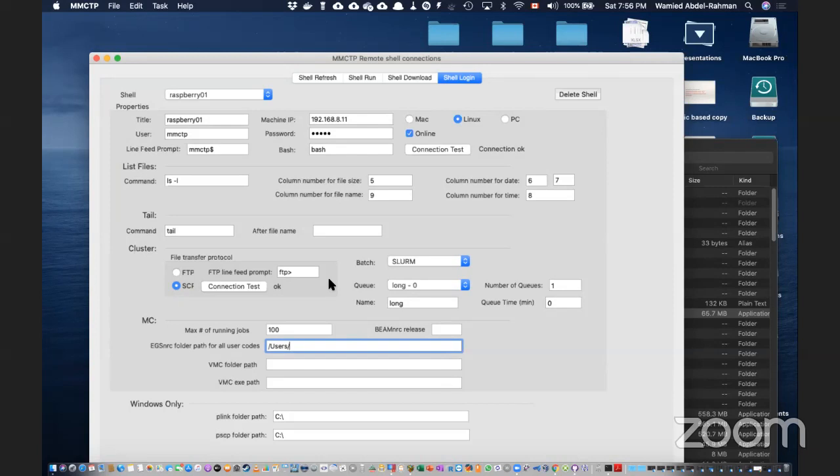So when I submit, for example, suppose I submit 16, it will distribute the 16 to all the nodes that I have, the calculation nodes. Now I submit another job with 16. Those will be submitted and temporarily placed in the queue. They will not run for calculations until one of the jobs that are running finishes. Then Slurm will start to submit.